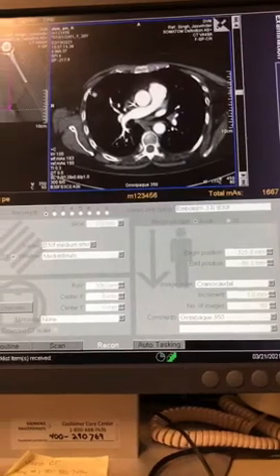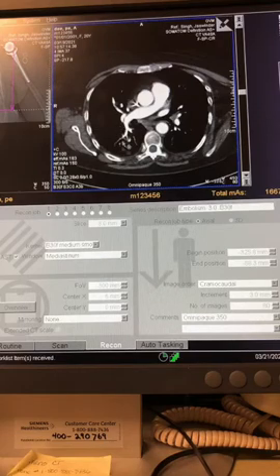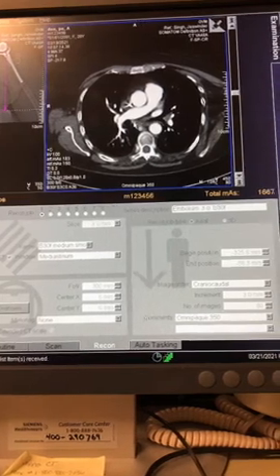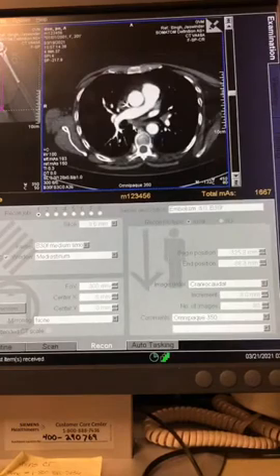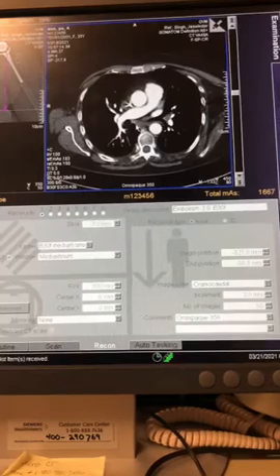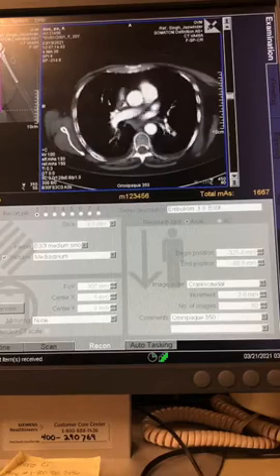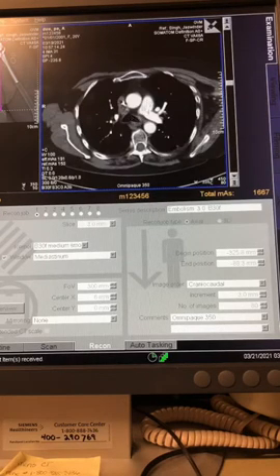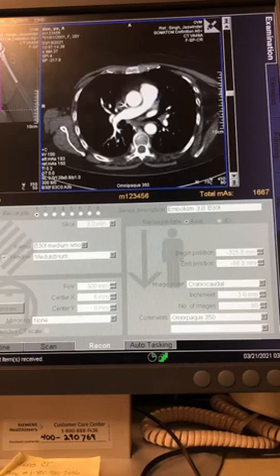So it is your job on critical results like brain bleeds and life-threatening things like PEs, that you can see that, talk to your radiologist and say, hey, Mr. Doe has a suspicious pulmonary trunk or right pulmonary artery, so on and so forth, right? You communicate that so that they can prioritize that, bump it up, and get that result to the ER and the patient can receive the care they need. Anyway, so it's a critical result. Make sure you recognize PEs. Google them. Once you've seen a couple, they'll be pretty obvious. And when you have this much contrast in the pulmonary arteries there, they are easy to see, okay?